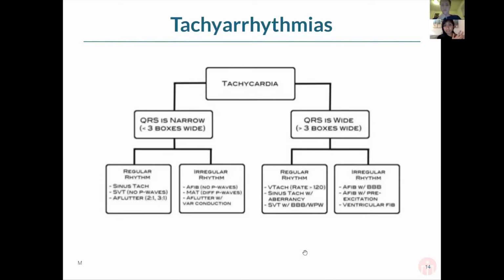That really means look for something else. It's probably not something cardiac. Look for some other process that's driving this. Another would be a supraventricular tachycardia. In those cases, sometimes we don't see P waves. So be aware, that's another branch point in that differential. And then atrial flutter. The caveat here is that you don't have a QRS after every P. There's a regular interval, and you do have a P before the QRSs, but you should be able to see that with something like atrial flutter, you have some sort of ratio between the Ps and QRSs.